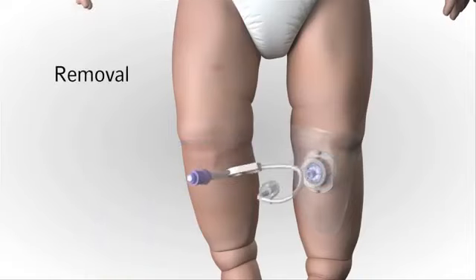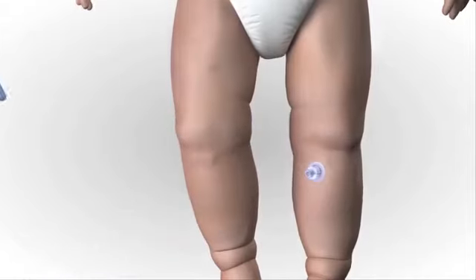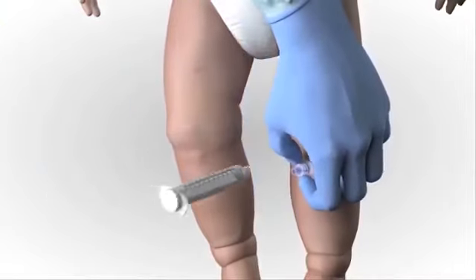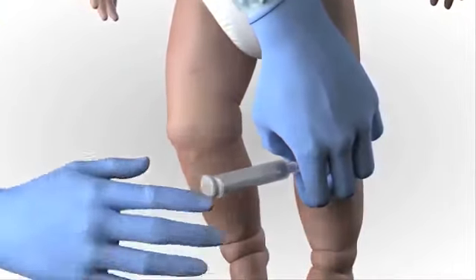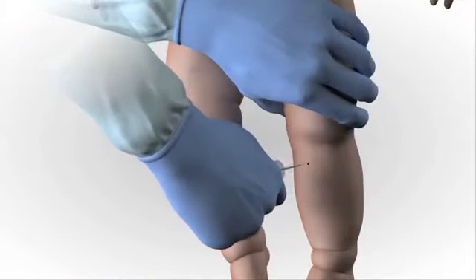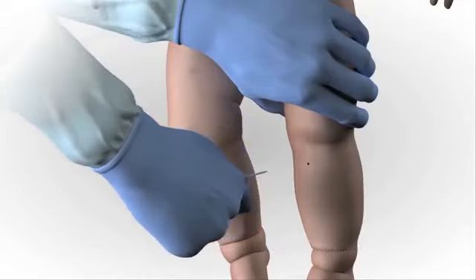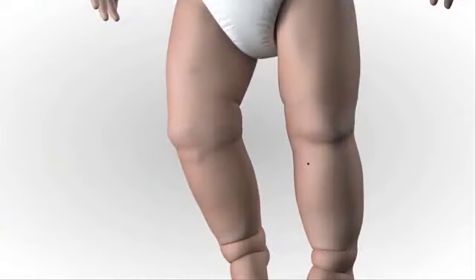Remove extension set and dressing. Stabilize catheter hub and attach a Luer-Lock syringe to the hub. Maintaining axial alignment, twist clockwise and pull straight out. Do not rock the syringe. Dispose of catheter with syringe attached into sharps container.